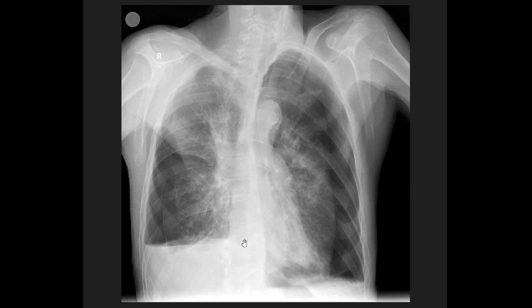So in this case, this is a very interesting case where we have also two pathologies. So both lung fields look problematic, I will just say it like that. So first we look at the lung markings, and we come to the line here, and we see this is the line of the pneumothorax, the line of the visceral pleura. This is a pneumothorax on this side. Then, as we look at this side, there is also a line, there is also a pneumothorax on this side.